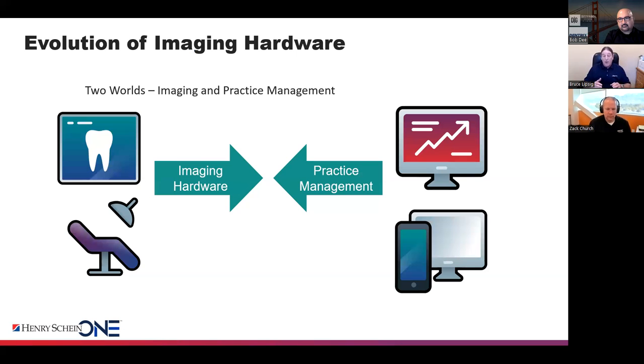There's another competitor out there that actually does it well with the imaging. Their imaging is very open architecture, and it even has 3D capabilities, just like ours, which we're about to show, whereas some of the other embedded imaging applications don't even have 3D or advanced capabilities. The one that does have advanced capabilities, though, was created 15 or 20 years ago as a separate product and is now bridged to another practice management where they don't get that bidirectional communication that comes naturally from being embedded.